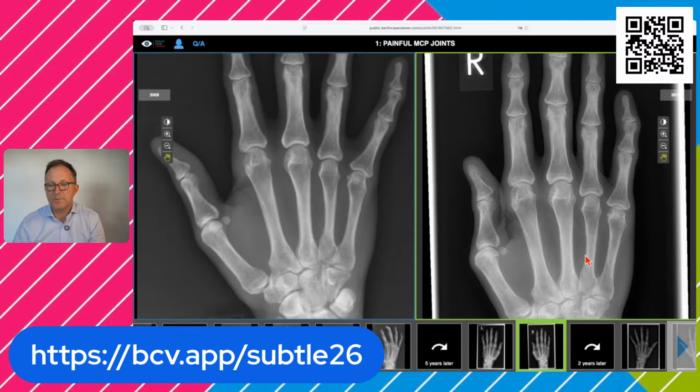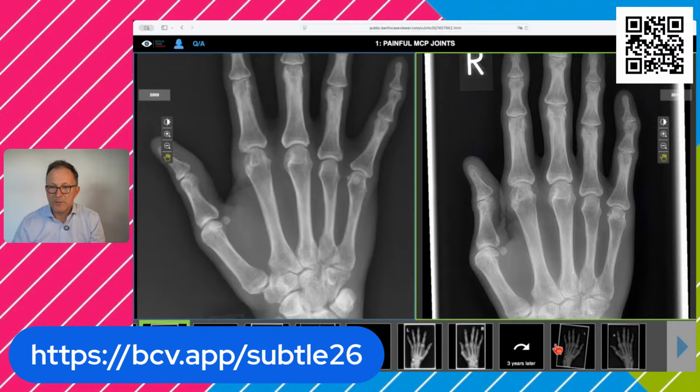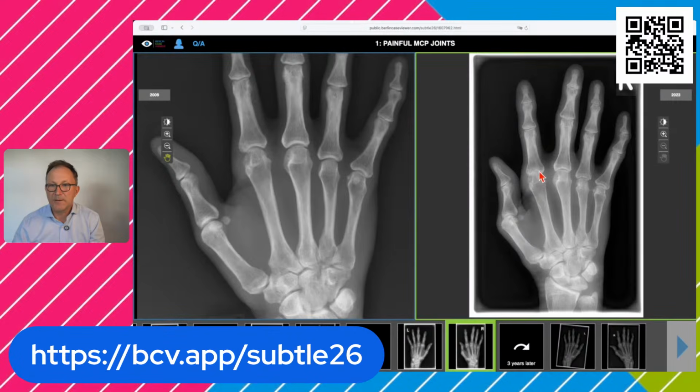And if this patient would come to you for first evaluation, because there's a change of department, or the patient has moved to a different city, has now a new rheumatologist, and you do the first evaluation, the older films are not there, then it would be difficult to say this is a rheumatoid arthritis. And then you can look at the case, finally, many joints are affected.